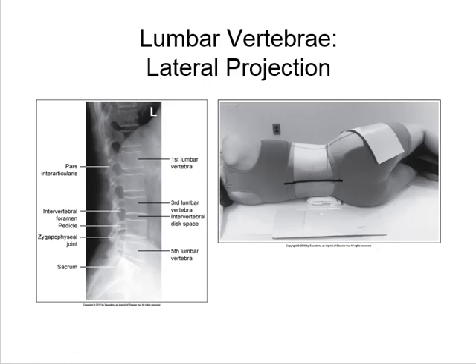But the other mistake is making the vertebra not parallel to the tabletop. And what you see sometimes on that is that the vertebra takes on a totally different appearance. Instead of looking like a box, it starts looking like a drawn tube.